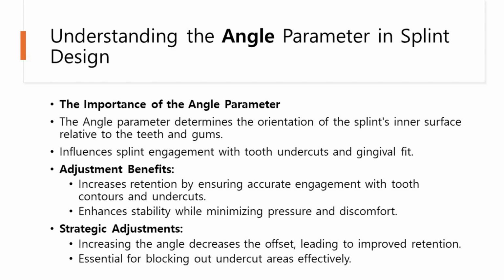Strategically increasing the angle reduces the offset. This closer engagement with the teeth enhances retention, crucial for the splint's effectiveness. Properly adjusting the angle is also vital for effectively blocking out undercut areas, ensuring the splint engages with the teeth where retention is strongest without causing discomfort.